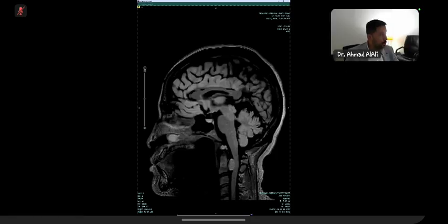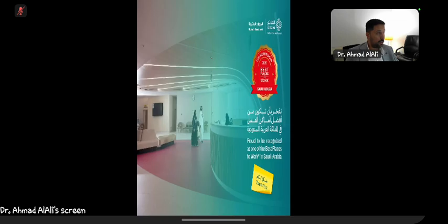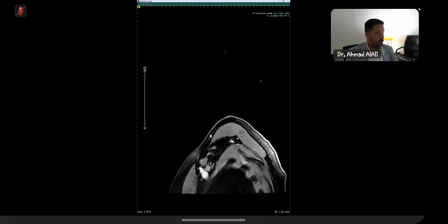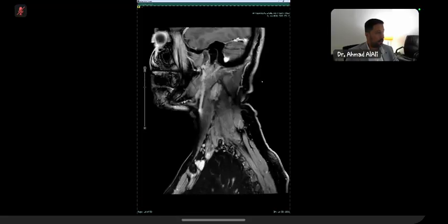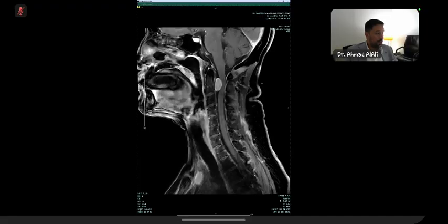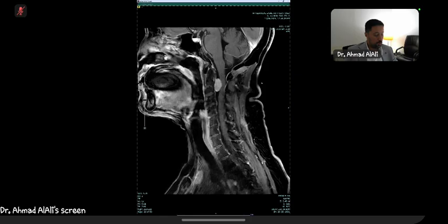Okay, right. So, for this patient, we had a cervical spine MRI to better characterize. I will show you the images. And for the time factor, I will go directly to the post contrast images. And here you are. These are the post contrast images. And this is the lesion. So, what do you think? Any other findings in post contrast images you want to add?